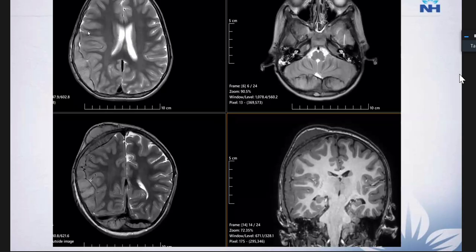Subsequently an MRI was also done to confirm that we are dealing with more than just a hemorrhage. These are the T2 weighted axial and T1 coronal images, in which you can see lesions with lobulated margins. The central part of the lesions was T2 slightly iso to slightly hyperintense, and on T1 again iso to slightly hyperintense. In between, you can see striations which are T2 hypointense and quite marked. They were seen in multiple bones, frontoparietal as well as occipital.